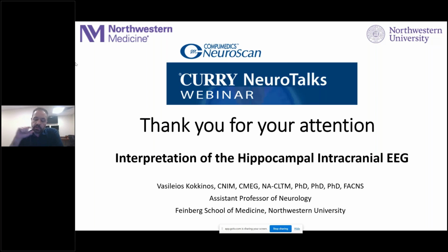The problem is that the recordings of the RNS are really short. They're like 90-second snippets that represent really very brief intervals of the whole recording. So although we see them in RNS, we cannot perform a really comprehensive study, because we're basically missing 95% of the signal, like on an overnight sleep or a 24-hour interval. So that's the limitation with RNS.